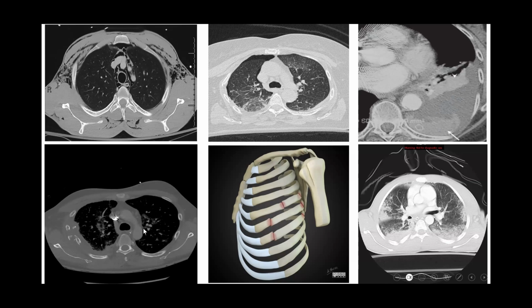So this is a CT of the chest. Bone window shows multiple rib fractures. Also, there is a fluid, maybe free fluid or hemothorax. This is a picture of flail chest. You can see here there is a two-part rib fracture in one rib and two or more contiguous ribs. This is important to mention in every report if there is any flail chest.